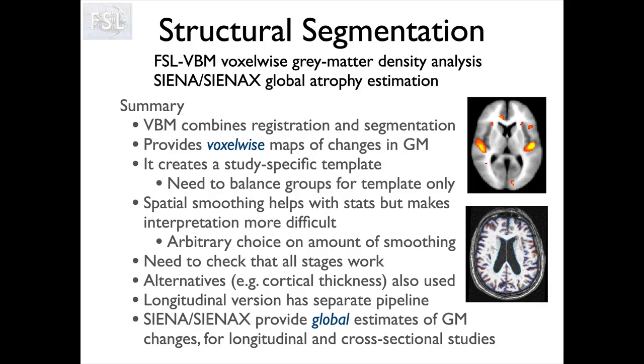But it's really useful to identify where things have gone wrong, so that you can go in and then fix them if necessary. Many times everything just works fine, but we cannot guarantee it, so it's always critical that you have a look at these.